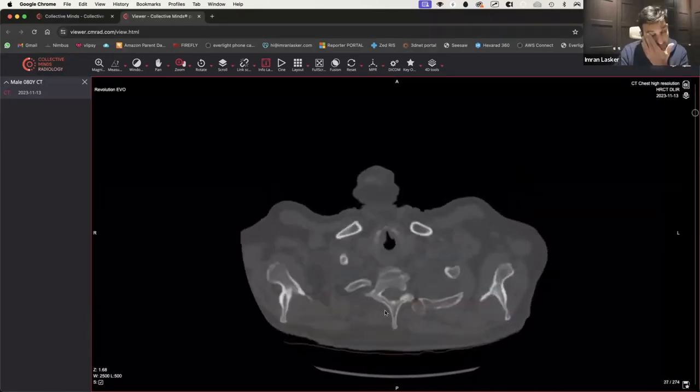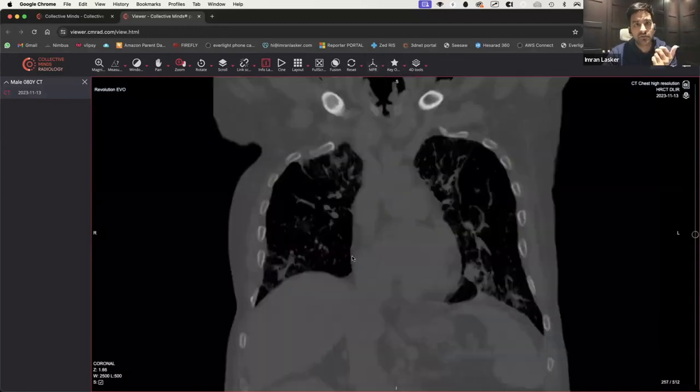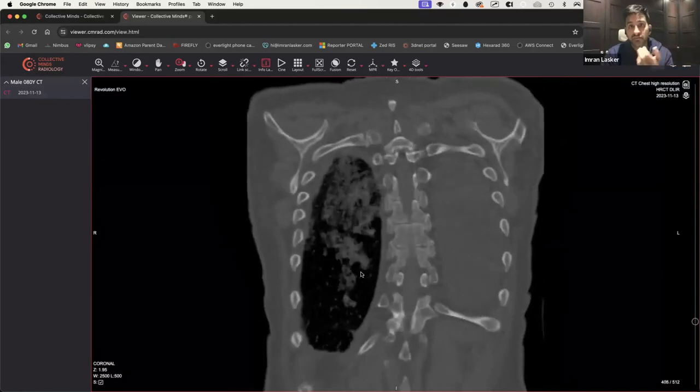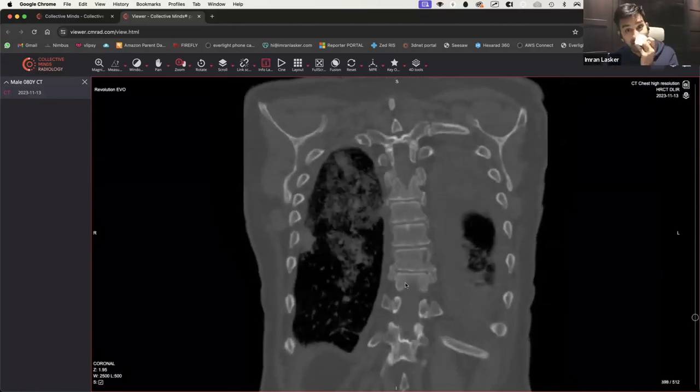And I'm going to show you something else about the platform, which I think is really impressive, is that you can actually do all the stuff that you normally do, do coronal, do axials, all from the same CT that you'd have in your work computers, which is why it's been so good for us to be able to teach people and not just show people the answers, but how to get to the answers too.